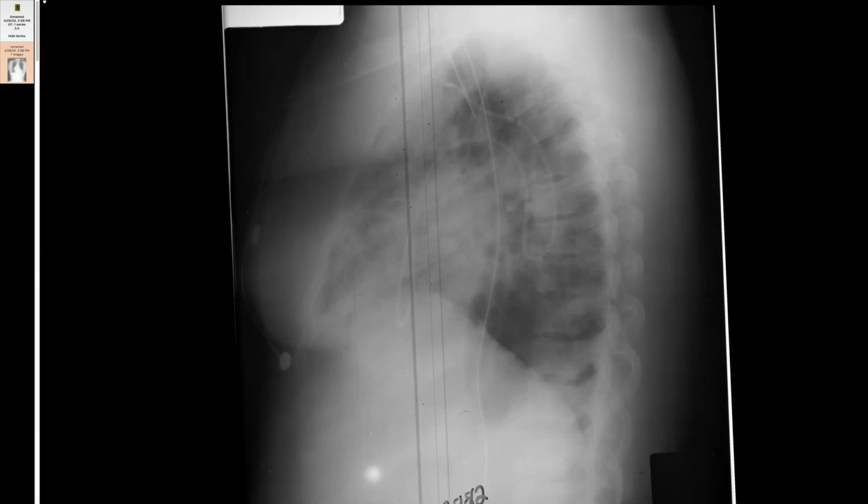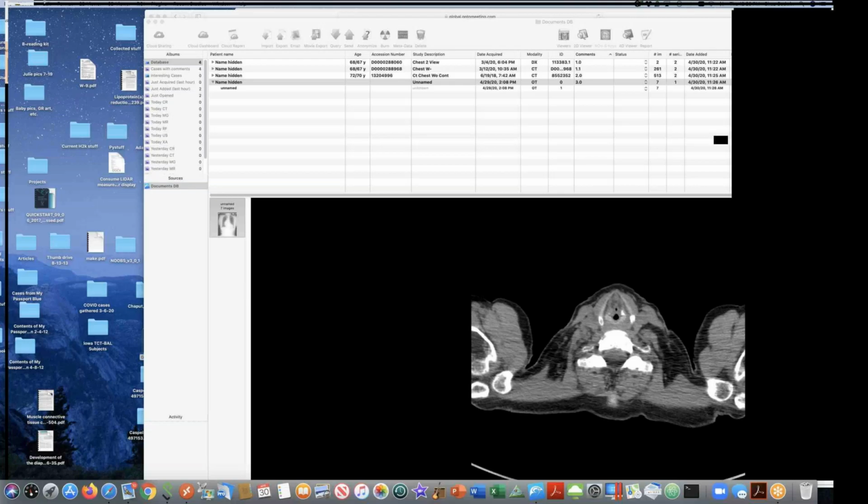Here's the lateral view showing the posterior course into the accessory hemiazygous vein, crossing into the azygous vein, and then the azygous arch taking it back to the cava, and then the right atrium and probably the right ventricle. So a truly snaky course here that illustrates a lot of the venous anatomy of the lung. So I thought these were worthwhile teaching cases. If I can get non-streaky versions, I'll try to post them for you guys.